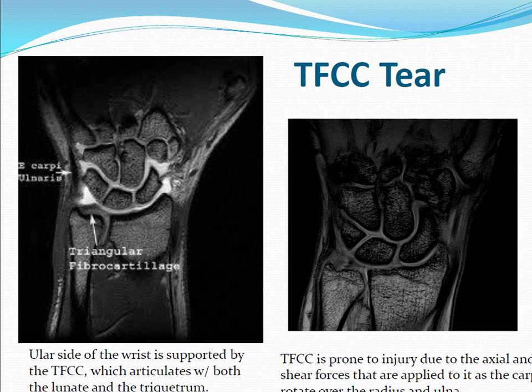Many times this tear can occur because of a trauma, any kind of trauma that could either break the ulna or tear the TFCC, something like a fall on an outstretched hand, that typical thing. Or sometimes it can occur just as a degenerative process, and it can be seen with rheumatoid arthritis or other inflammatory arthropathies or depositions. And so you may be evaluating this with MRI, and what you'll see there is similar to other things. You just see a fluid signal where you should normally see a nice black cartilaginous signal.